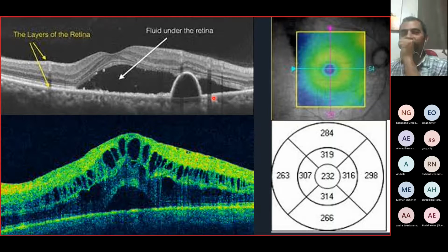CSR, so central serous chorioretinopathy, can cause this appearance. And there is another important entity, which is the Vogt-Koyanagi-Harada disease. Harada disease, again, can cause neurosensory detachment and pigment epithelial detachments like that. So if I see this OCT, even without seeing the patient or the fundus colored photo or the fluorescein, I would think of either CSR, this is on top of the list, or Harada disease as a differential. But if I look at this one, the main difference is that there are intraretinal fluid cysts.